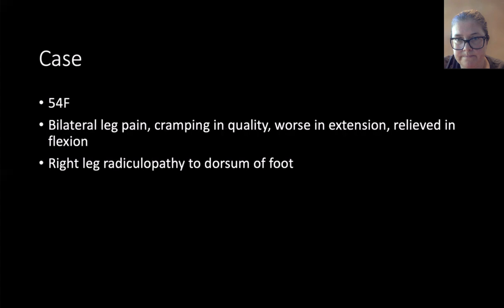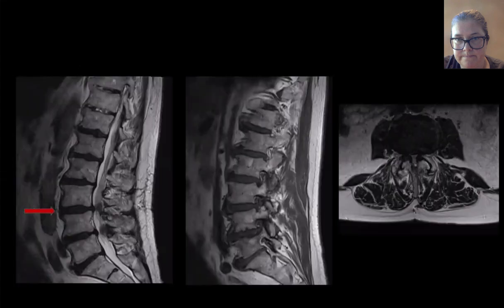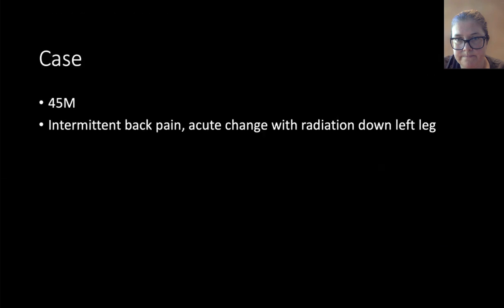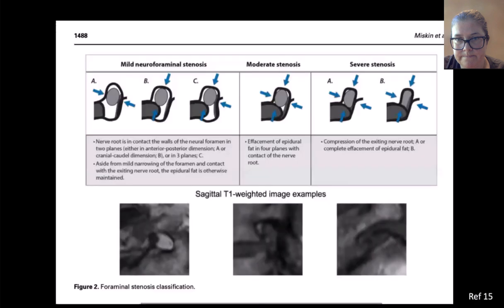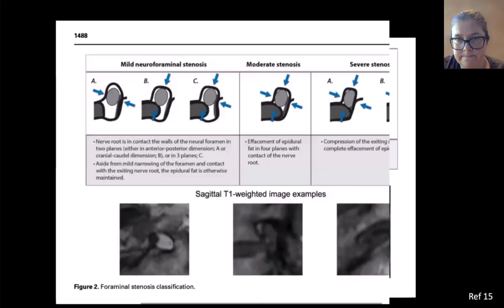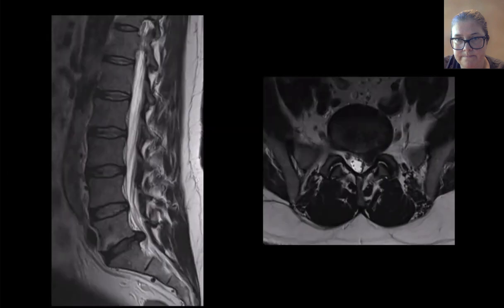Shauna, can I just interject? Can you go back one minute? I don't understand the foraminal, no, not the foraminal, where the disc is tightened in its lateral recess. You used another term, subarticular. Can you go back to the sagittal image you had a minute ago?